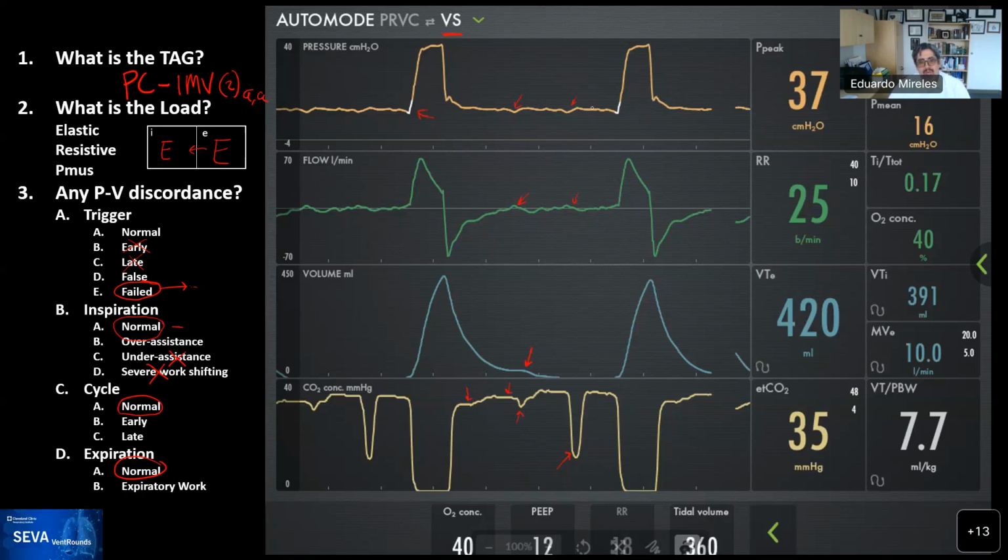And the third one would be that the threshold for pressure is set too high. Usually the key item you would see there is a drop in the pressure when the patient is triggering, where it goes below the mark for that pressure trigger. Now, it could be that we don't see it because the gain is set inappropriately. So that's what is left.